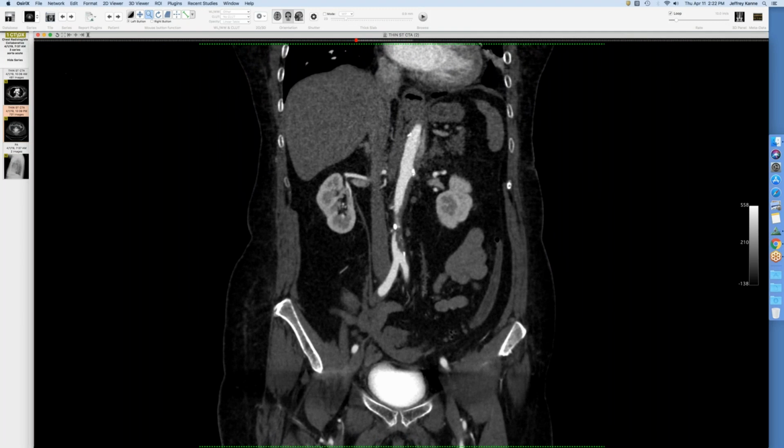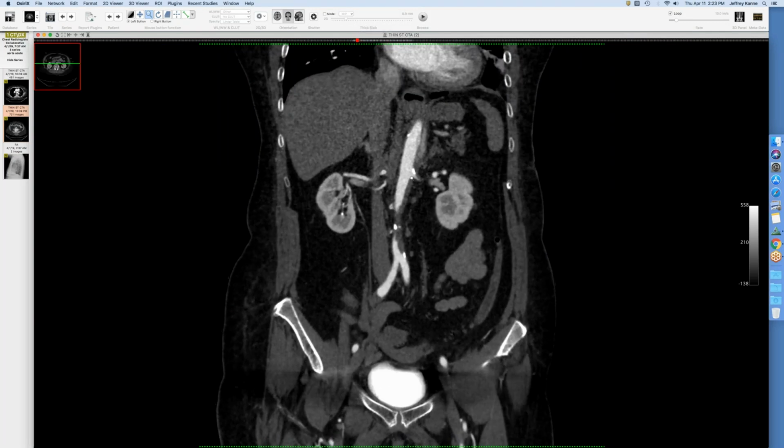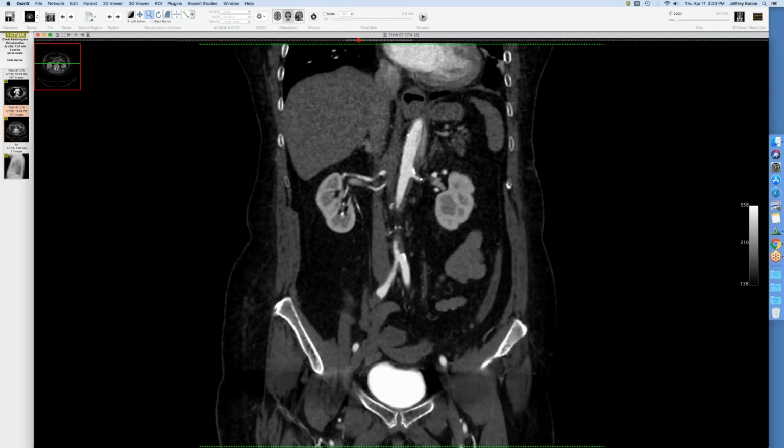Right, so here you can see the false lumen. And there's the left renal artery just coming right out of there, passing right through that lumen. It's like the false lumen just went around it, around and about it, without taking it out. Because usually one of the renal arteries comes off the false lumen if it looks like that, if it's on the side like this.